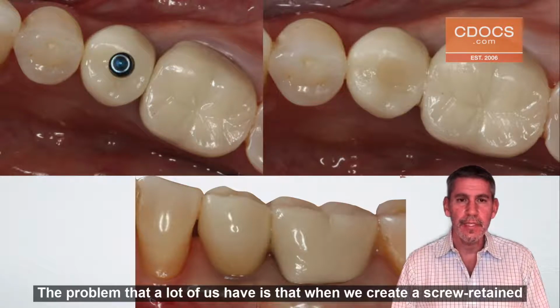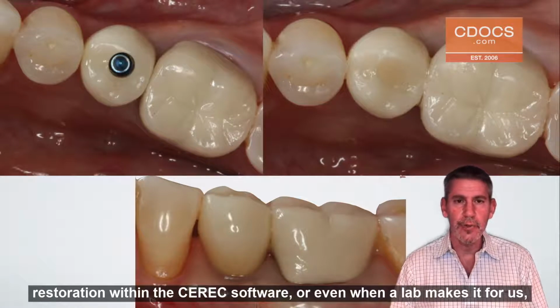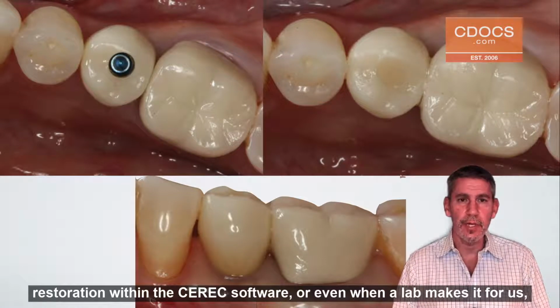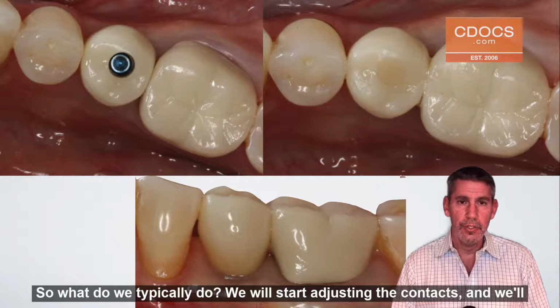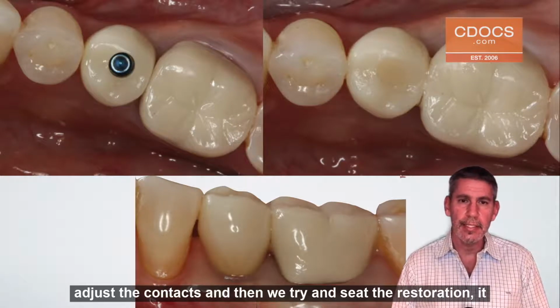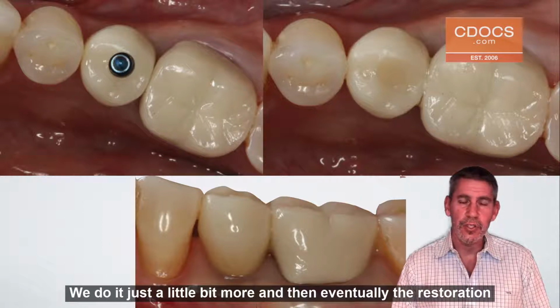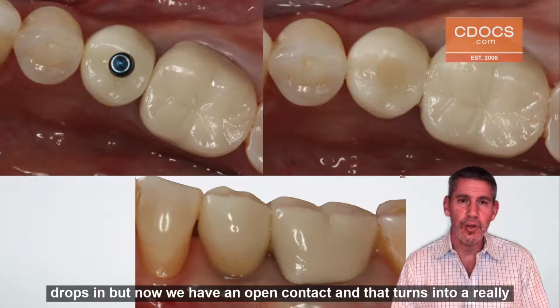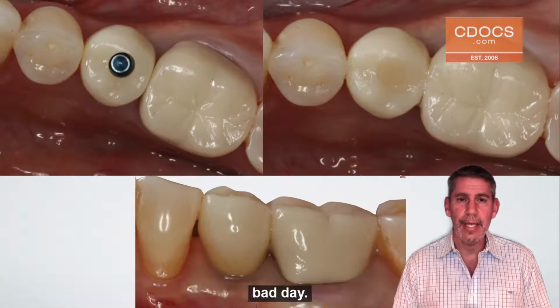The problem that a lot of us have is that when we create a screw-retained restoration within the CEREC software, or even when a lab makes it for us, we go to seat that restoration, and oftentimes we find that the restoration is not completely going down. So what do we typically do? We'll start adjusting the contacts, and then we try and seat the restoration. It goes down just a little bit further, so we feel like we're on the right track. We do it just a little bit more, and then eventually the restoration drops in, but now we have an open contact, and that turns into a really bad day.